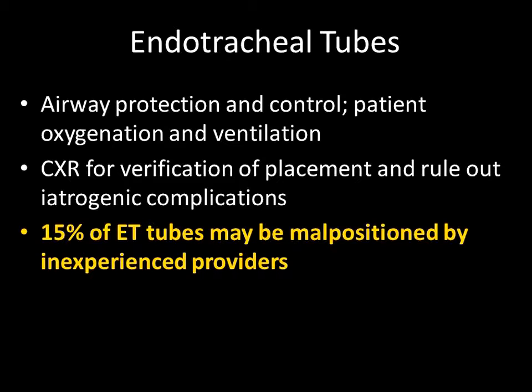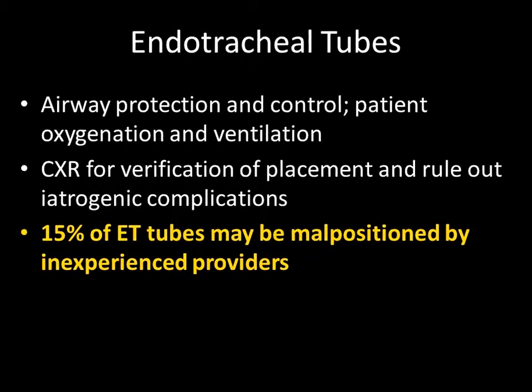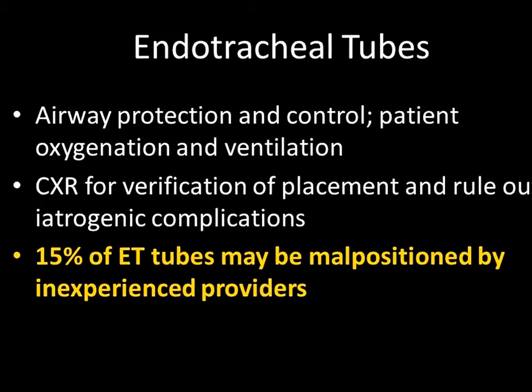Chest x-rays are often done after the placement of an ET tube. This is to verify placement, but also rule out any iatrogenic complications. Verifying placement is important because 15% of ET tubes may be malpositioned when placed by non-experienced providers.